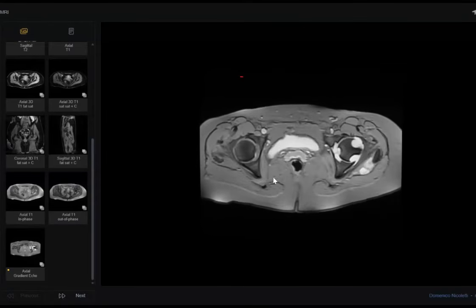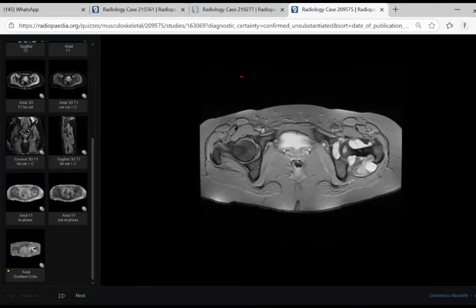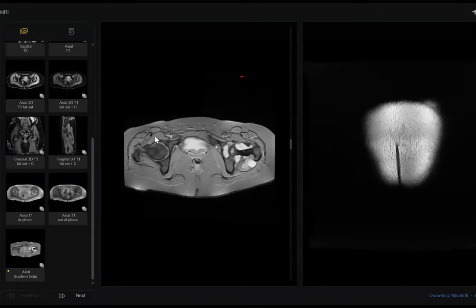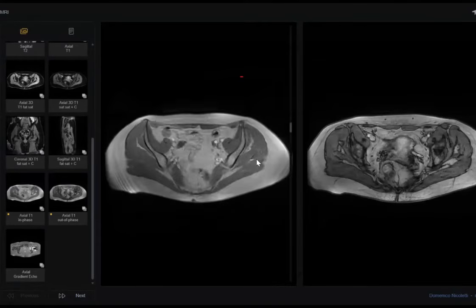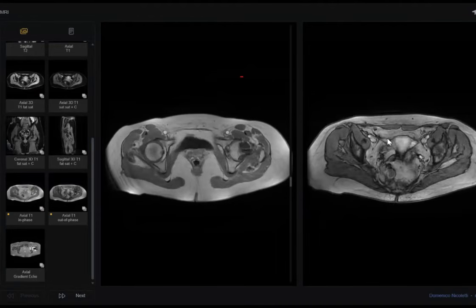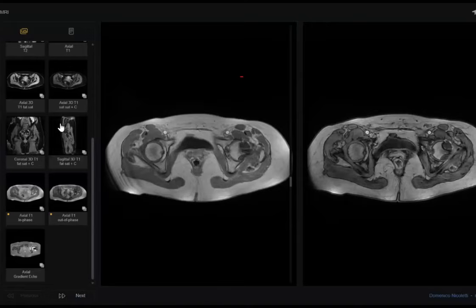There is significant bony remodeling. What's your final diagnosis, sir? These are not giving the bone signals to suggest any synovial osteochondromatosis, but definitely soft tissue masses.